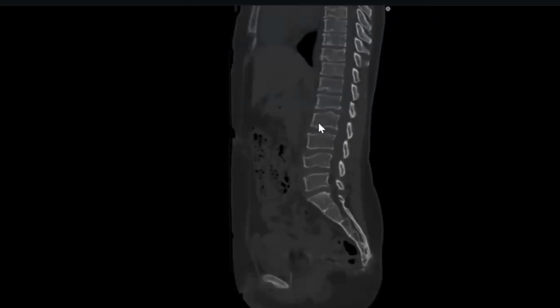If I give this alone, it is acceptable if your diagnosis is Scheuermann syndrome. But in combination with other epiphyseal abnormalities, the acceptable diagnosis here is spondyloepiphyseal dysplasia. Why? Because there is bilateral hip abnormality.